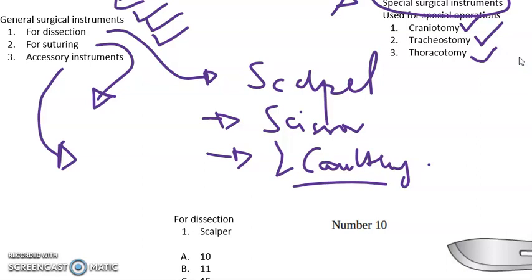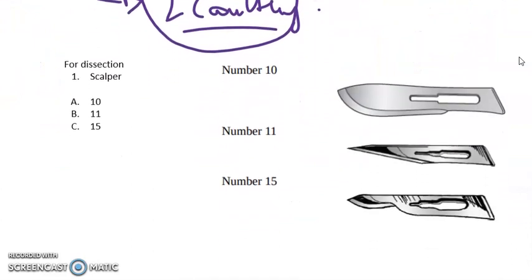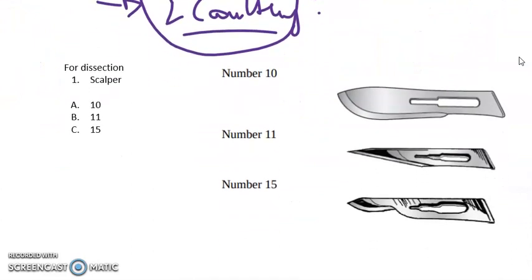These will also be instruments that help open the incision or wound, so that we could see what's deep in the abdomen, or what's deep in the thorax if we are doing a thoracotomy. So with that being said, let me just explain about the instruments that are used for incision. Instruments that are used for incision are divided into three groups: the scissors, a scalpel, and electrocoagulator.